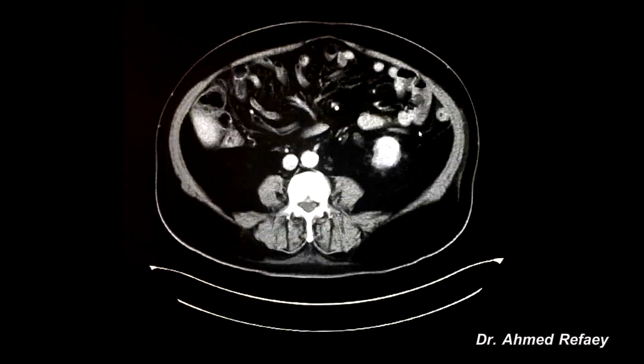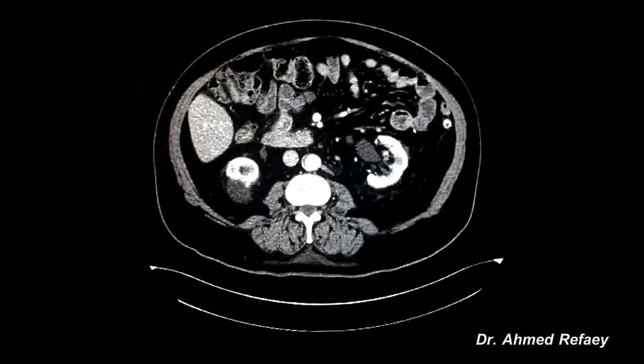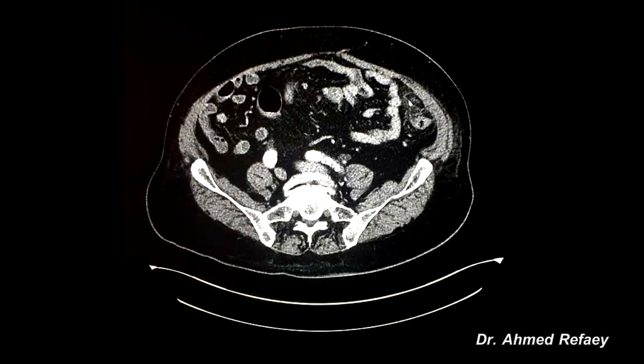There is no evidence of any wall thickening or pericolonic mass lesion to suggest diverticulitis, and there is no evidence of any colonic mass lesion or signs of intestinal obstruction. Adjacent to the lateral aspect of the descending colon, as you see here, there is a fat density mass with a thin high density rim. You can appreciate also that there is significant surrounding inflammatory fat stranding, as well as a central hyperdense area representing the thrombosed vascular pedicle, as you see in this image. This is a classical feature of epiploic appendagitis.